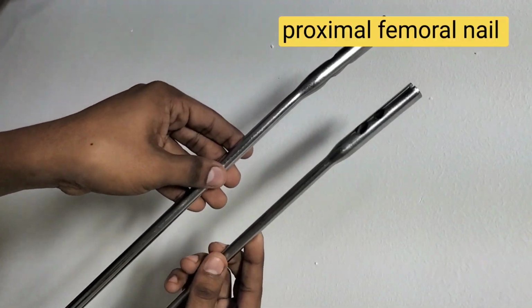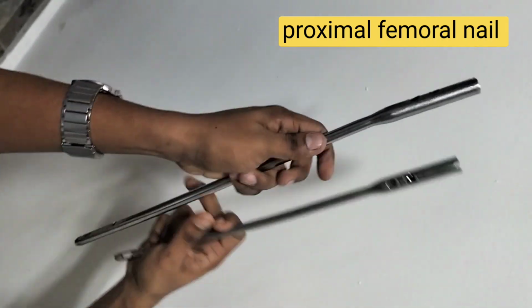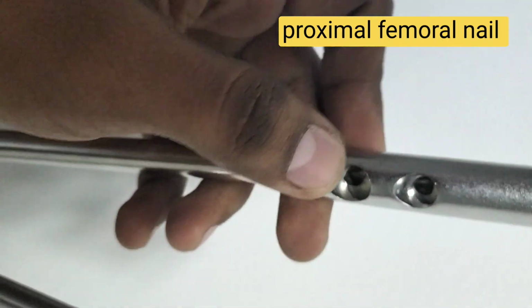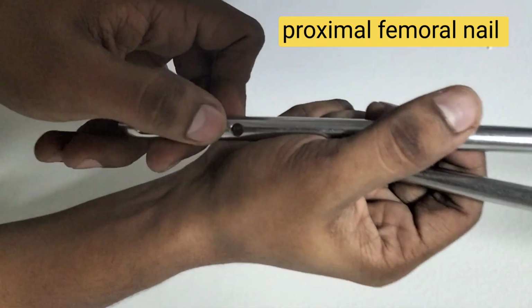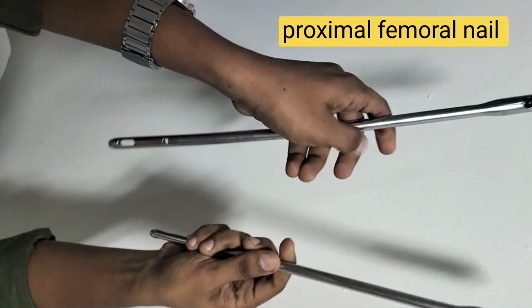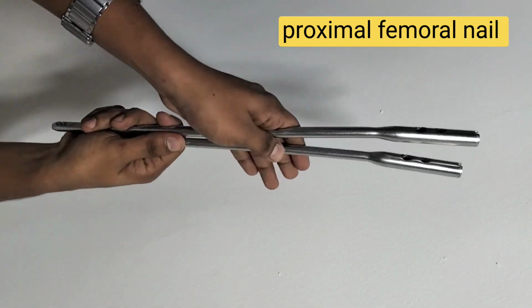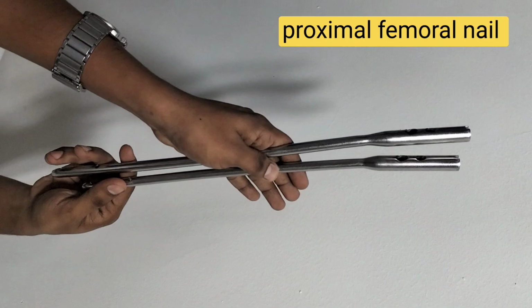This is a proximal femoral nail. This is long one, this is short one. This big hole is for a compression screw. This small one is for a derotator screw. This short one is static. This is dynamic. This is long one. This is short one. Both are proximal femoral nails, used for subtrochanteric and intertrochanteric fracture of femur.